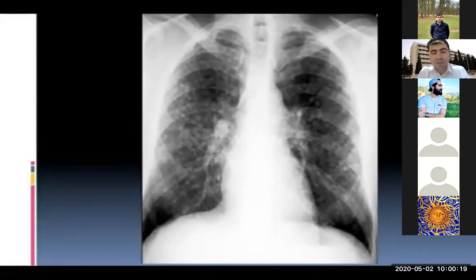So about this chest X-ray, actually, it is a case of miliary shadowing again, and there are bilateral miliary shadowing. We don't know actually the history of this patient. We don't know whether this is TB because we are missing the data. That's why I tell you always that you have to write down some of the notes of the patient.